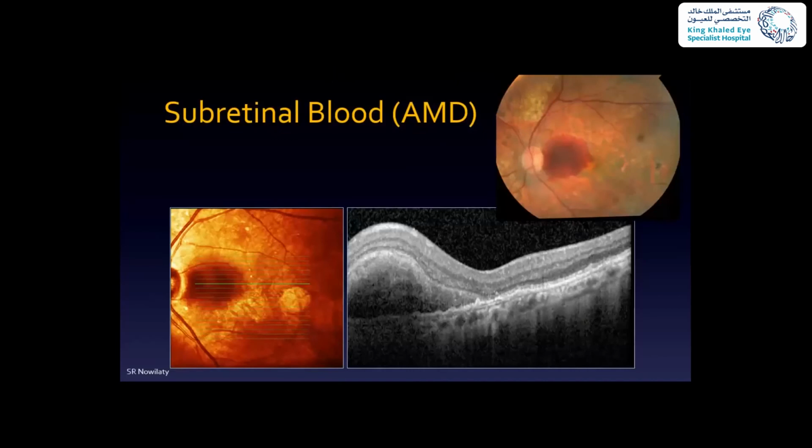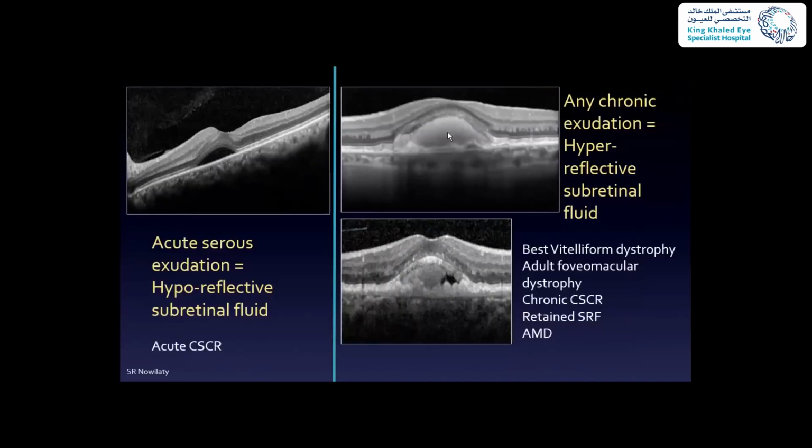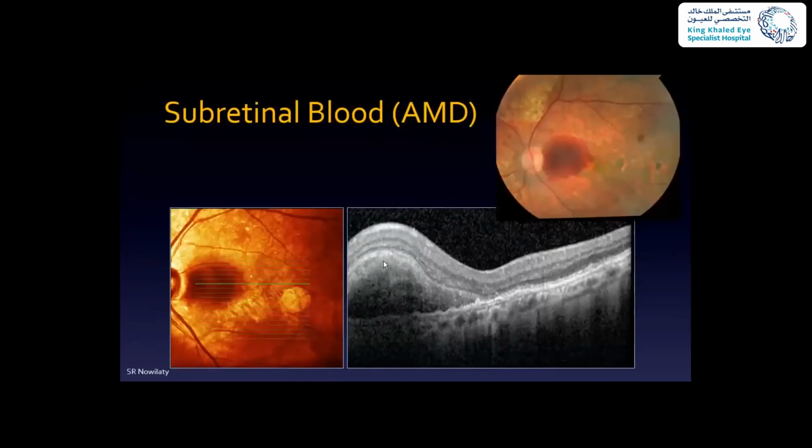Now, if you have subretinal blood, it is again going to show hyperreflectivity, but it tends to shadow progressively. Look at the difference between this one, where you have fluorophores. It doesn't shadow much, but it's quite yellow, and it gives this appearance, this hyperreflectivity without much shadowing behind. There is some shadowing, I mean, look here, you do have some shadowing, but it's not too much. While when you have blood, it is much more compact.